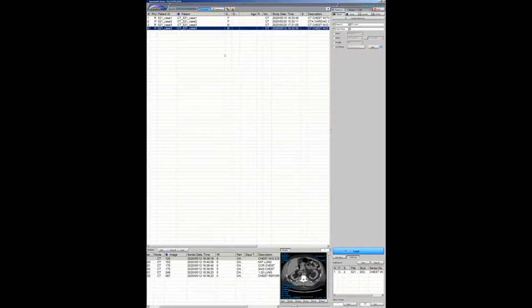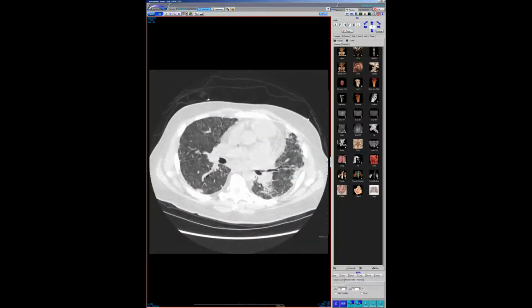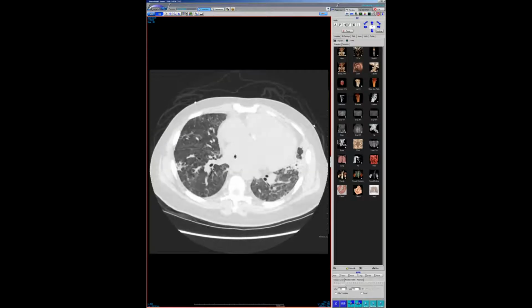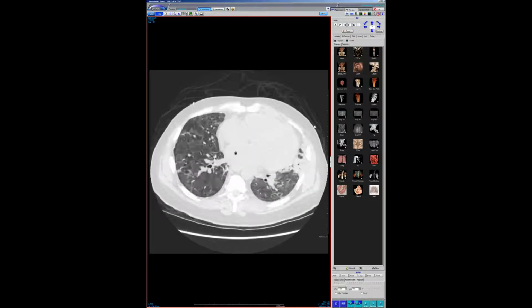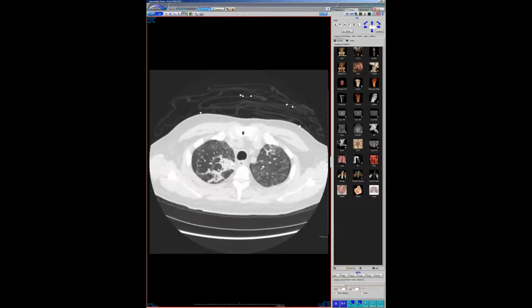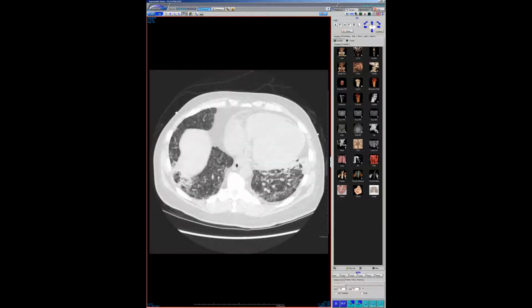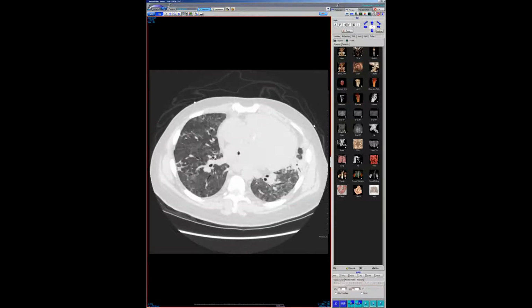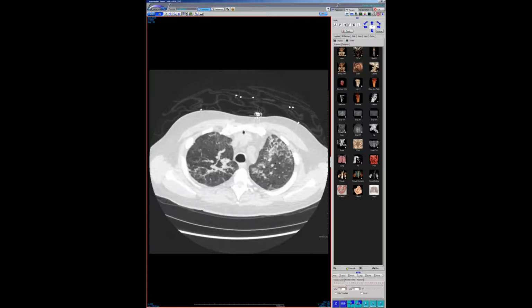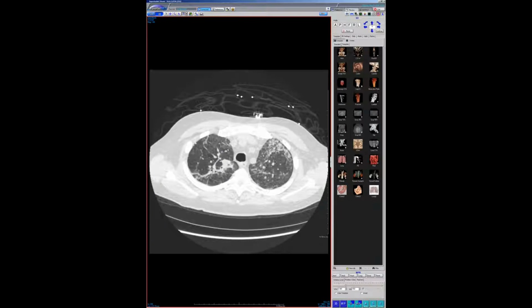The interesting thing is, I'm showing the second one. He wasn't getting better with anything, and then they started him on steroids. And this is what he looks like a few days after starting a steroid, so dramatically improved. I don't know. Treating some organizing pneumonia. Yeah, exactly, something's treating some organizing pneumonia, but that was a weird case. I agree. Someone told me that, and I was like, I've never seen it look like that.